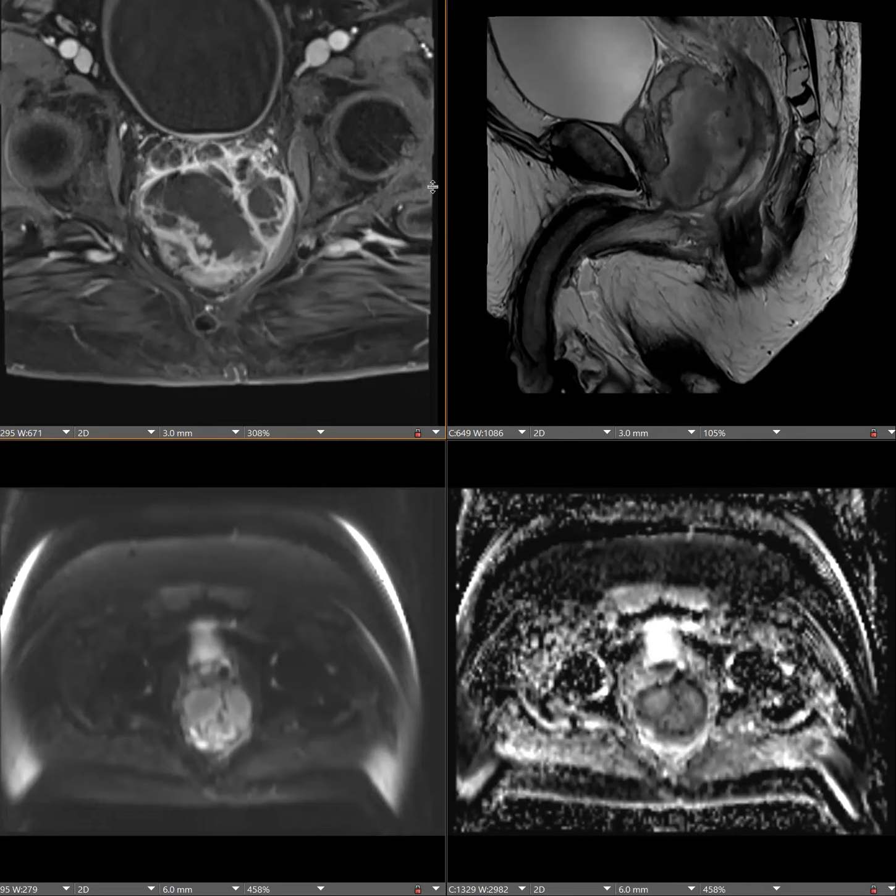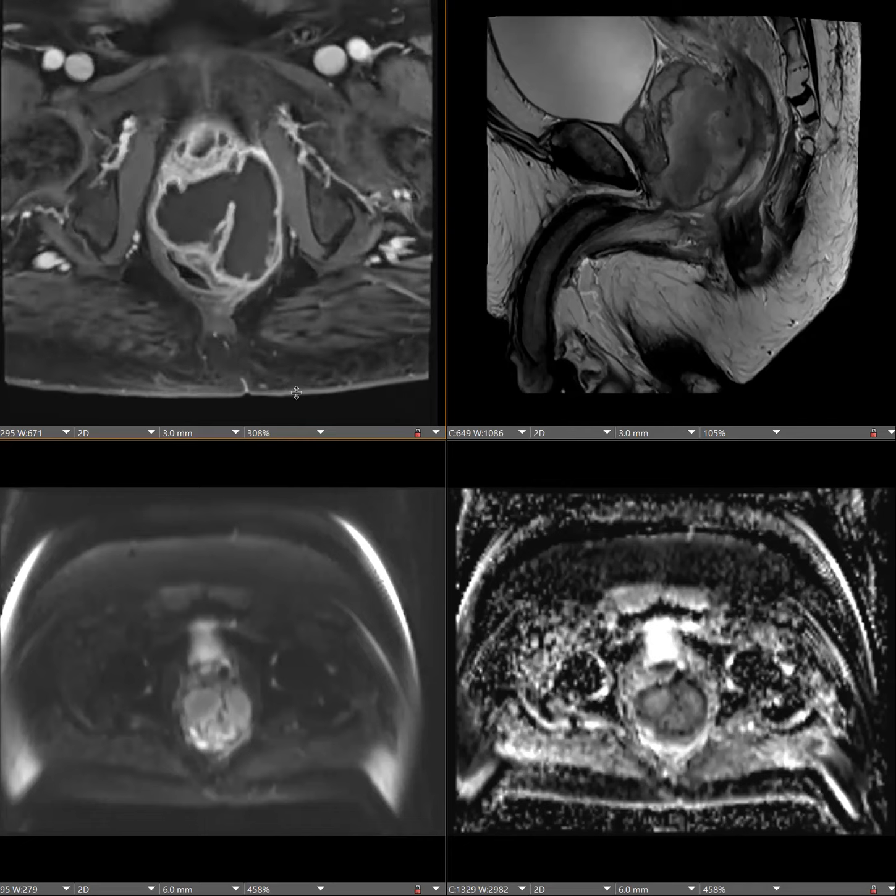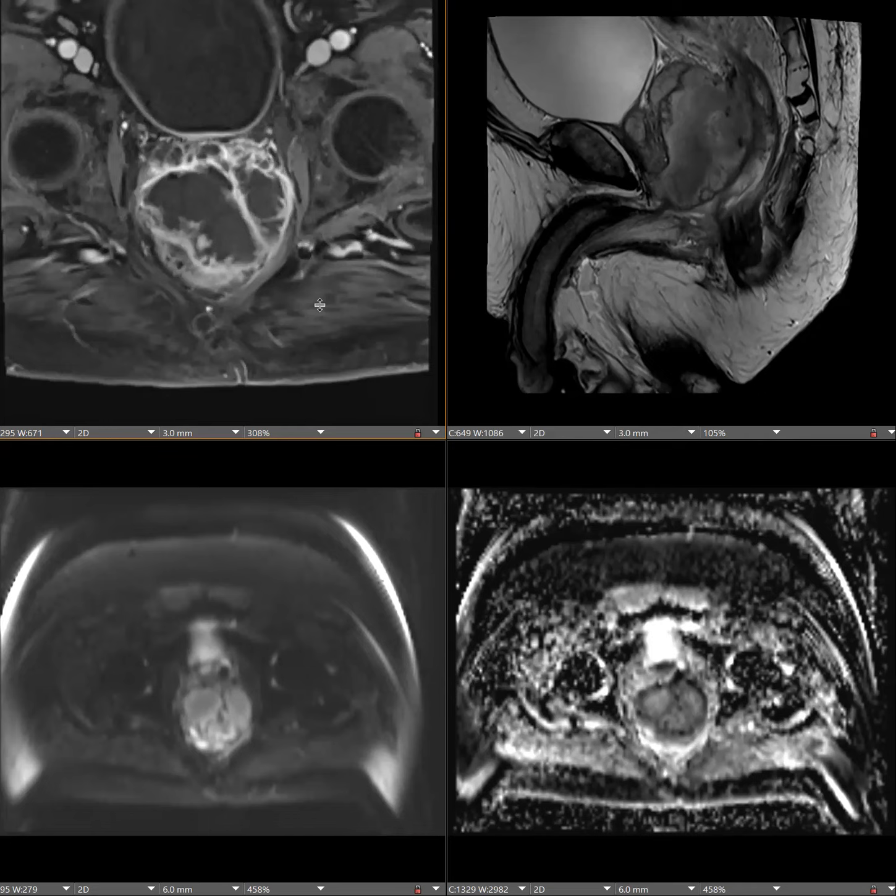So this was a nice appearance for an atypical case. Also, the literature mentions that xanthogranulomatous prostatitis is usually a very close mimicker of a necrotic prostatic adenocarcinoma, and the pathology is the one that can differentiate them. The next differential is a prostatic abscess, but patients usually present with severe pain and tenderness on rectal examination and all those constitutional symptoms, which this patient did not have.